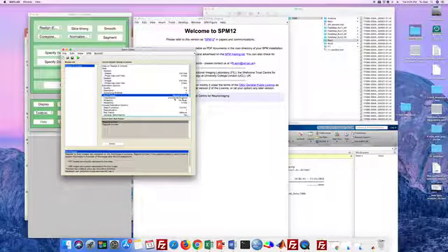So here, one thing we may need to revise for other data sets is where your reference image is, meaning which image to register to. Here we select the default, the first image, because in the following step we want to co-register your EPI image to your T1 image.